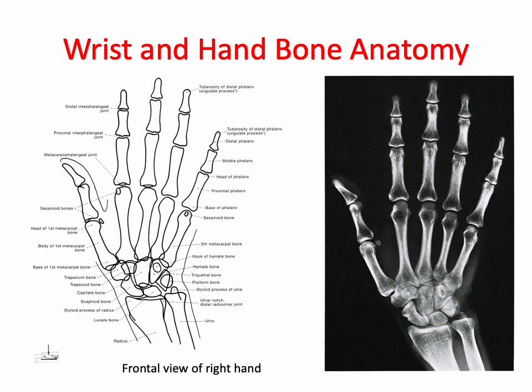We have a few sesamoids around the hand, so sesamoid here and here, but they're very variable. We have the proximal, middle, and distal phalanges. We've got the tufts of the phalanges as well. Then we've got the carpometacarpal joints, the metacarpophalangeal joints, and the proximal and distal interphalangeal joints.